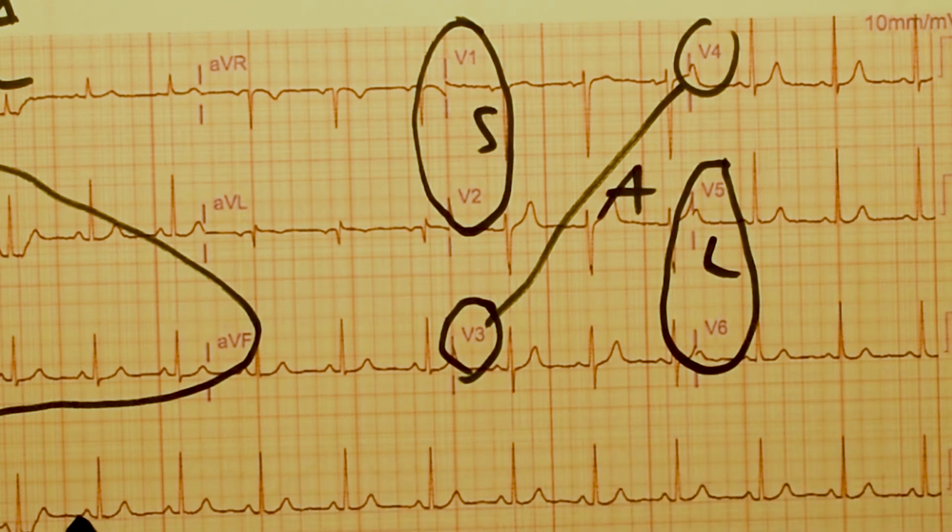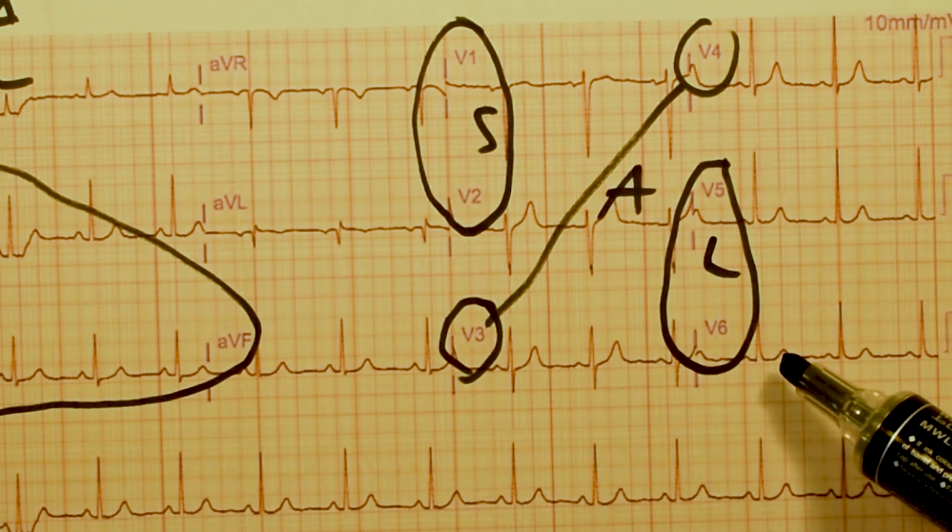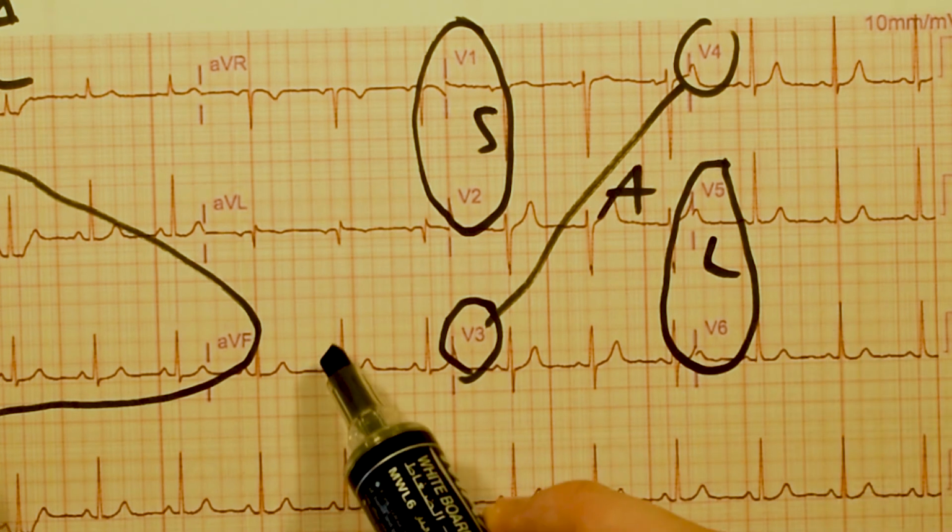Cool. Normal. Do we have P waves before every QRS and a QRS after every P? I can see that we do. It all looks normal. The rate looks normal. The distance of your P and your Q interval is normal. Your QRS interval is normal. Your T wave looks much smaller than 1/3 of your R wave. And then you can look for any ST elevation or any ST depression. And from what I can see there's nothing.